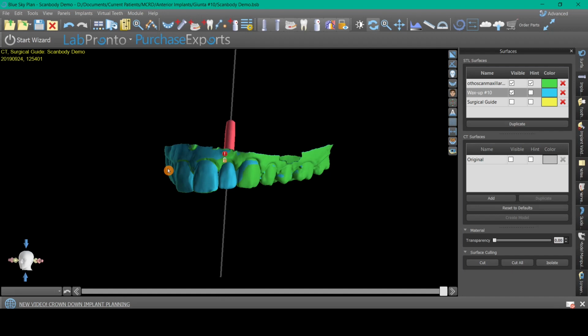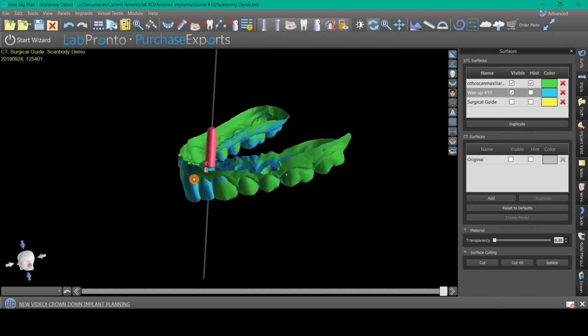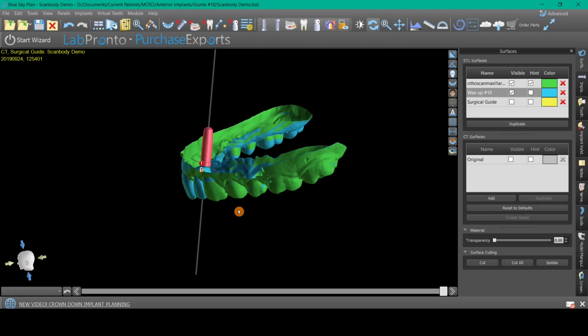There are some library systems within Blue Sky that allow you to design your crown completely within Blue Sky through a tie base and essentially export your crown in the crown bottom like form of the tie base. Then you get your crown file and glue it onto your tie base, and you essentially accomplish the same goal. I want to be able to export a crown out of Blue Sky, glue it to a tie base, and deliver a provisional at the same time of surgery.